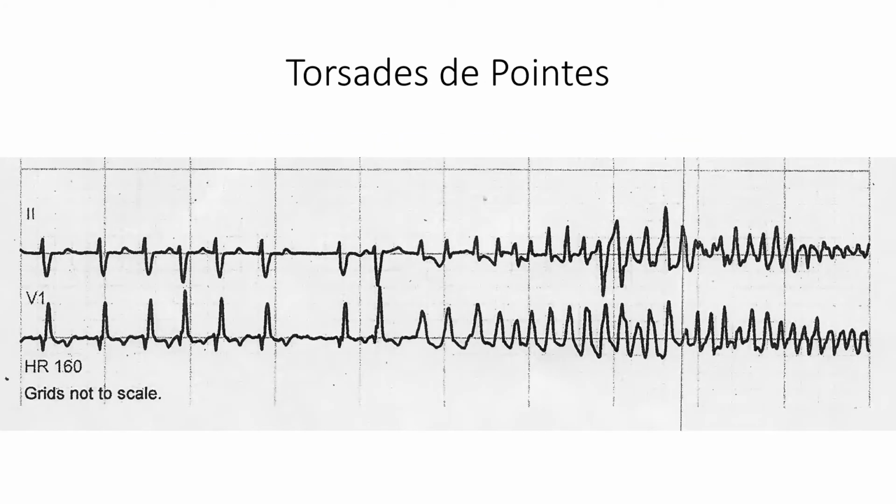Here's a classic arrhythmia that you will see on the wards. This is a potentially fatal arrhythmia called torsades de pointes, or twisting of the points, which is a common polymorphic ventricular tachycardia. Notice how the rhythm is changing and tends to have big and then small VT waves. If you hallucinate a little bit, it almost looks like you're having party streamers.